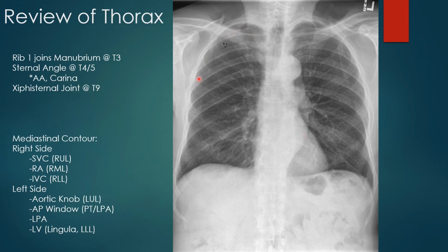Moving on to the lungs, I like to go around the ribs, look at the costodiaphragmatic recess, make sure there's no blunting, and look for any other abnormalities. You can use the silhouette sign to determine the location of structures, but it's also useful in IDing pathological change.